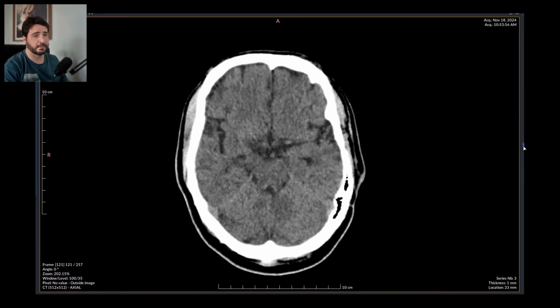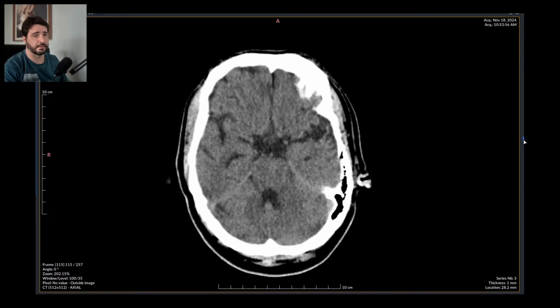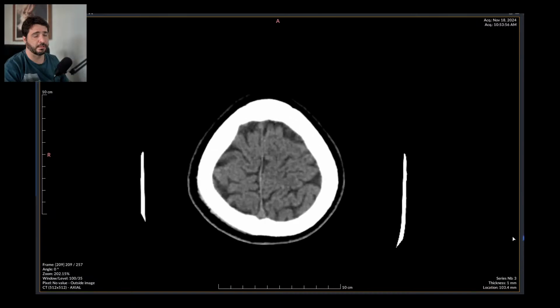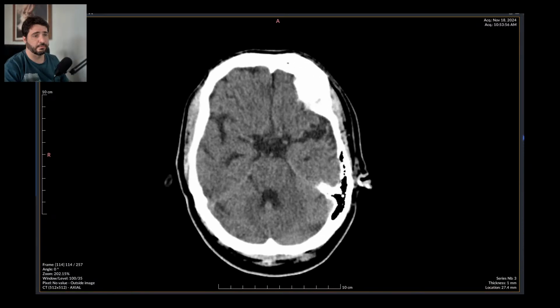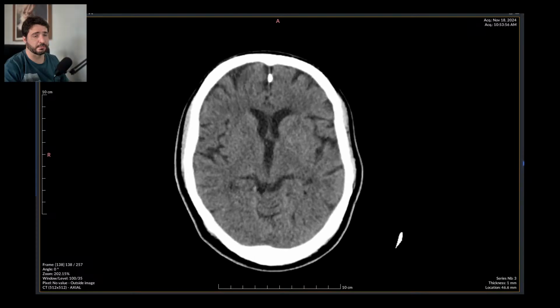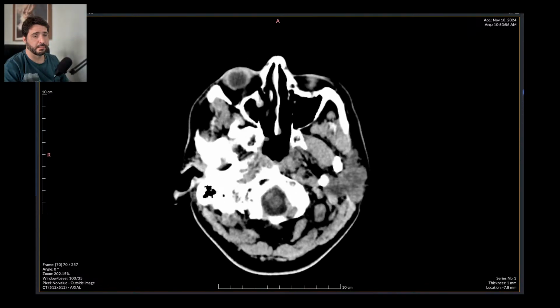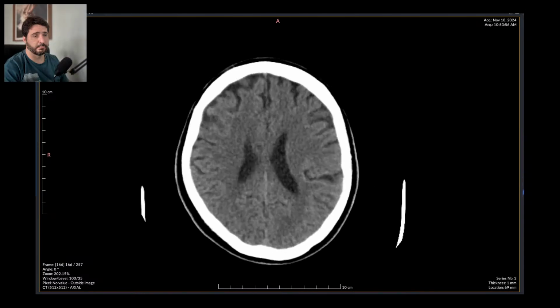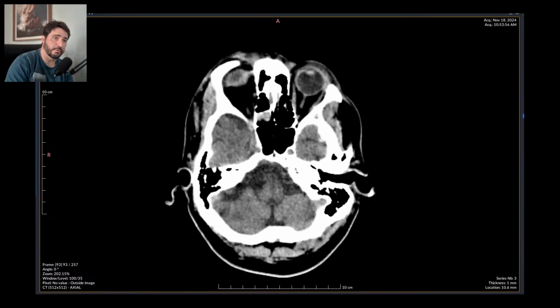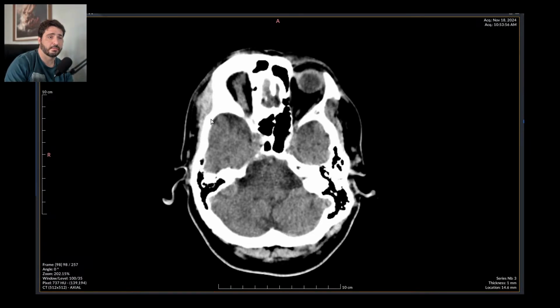See? This left temporal lobe isn't normal. Could be sclerosis, could be some sort of scar tissue related to a previous trauma. Usually brain contusions are on the frontal lobes and on the temporal poles right there.